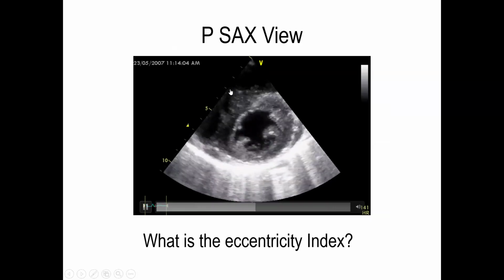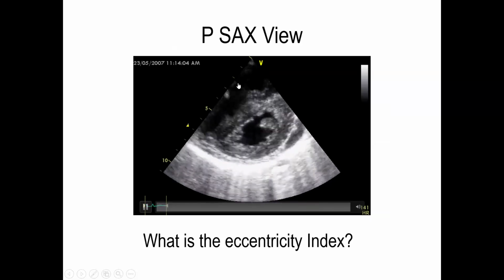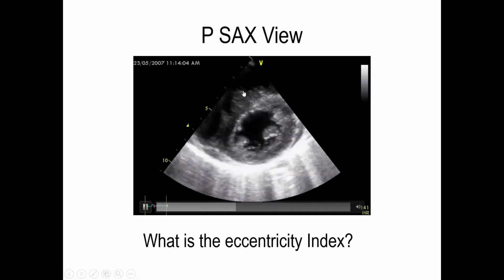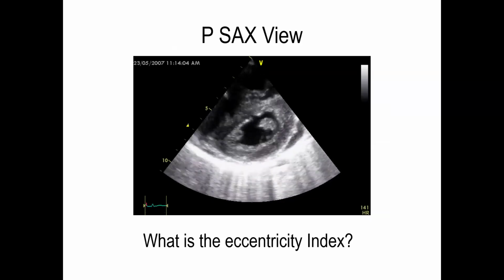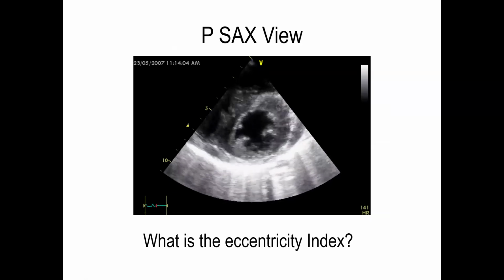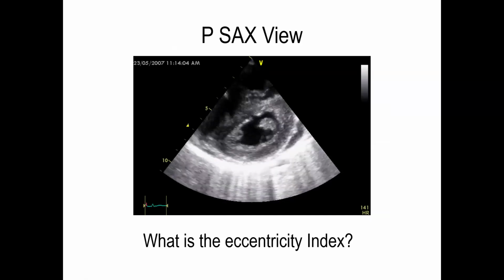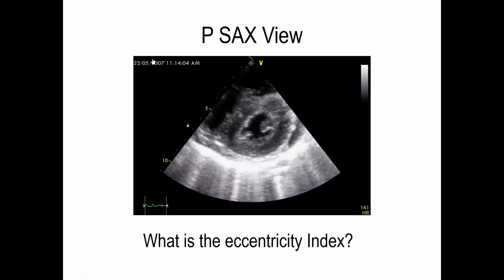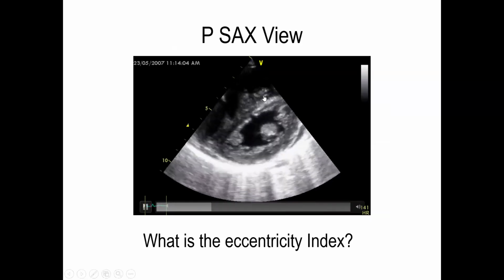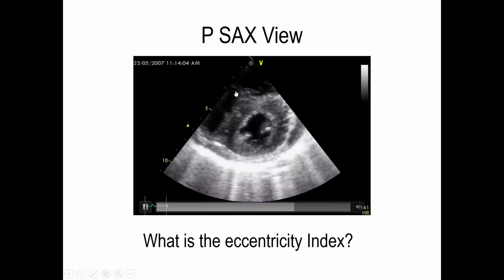This is known as systolic bulging, and it is suggestive of pressure overload rather than volume overload. So how do we differentiate pressure versus volume overload? A D-shaped ventricle during diastole that further changes to sickle shape during systole is pressure overload. And if it remains D-shaped during diastole and nothing significant changes during systole, it's volume overload.